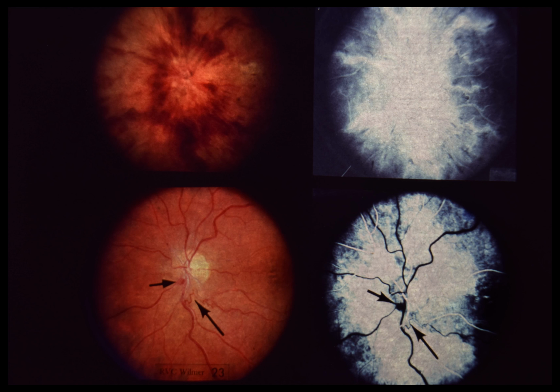1.5 years later, visual acuity in the left eye was 20/25 with mildly defective color vision. The left pupil was slightly less reactive to light than the right pupil, and the left visual field was normal. Lower left. 1.5 years after initial evaluation, the left optic disc is slightly pale. An abnormal corkscrew vessel is seen at the disc margin at 7 o'clock.